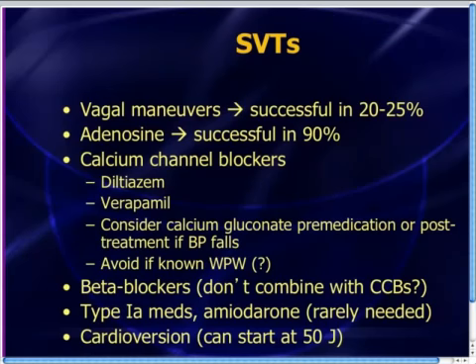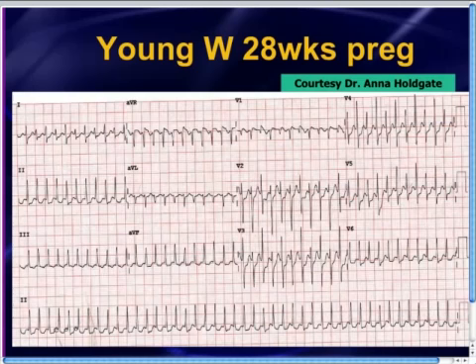Actually, you know what? Let's go back to the original EKG just to make sure that everyone's on board with our diagnosis. We got 3 possibilities: sinus tach, SVT, and flutter. So, is this possibly sinus tachycardia? Well, with the rate of 270, you automatically know it can't be sinus tach because nobody runs their sinus rate that fast. But looking carefully for the atrial activity, there's no PQRS, PQRS, PQRS.